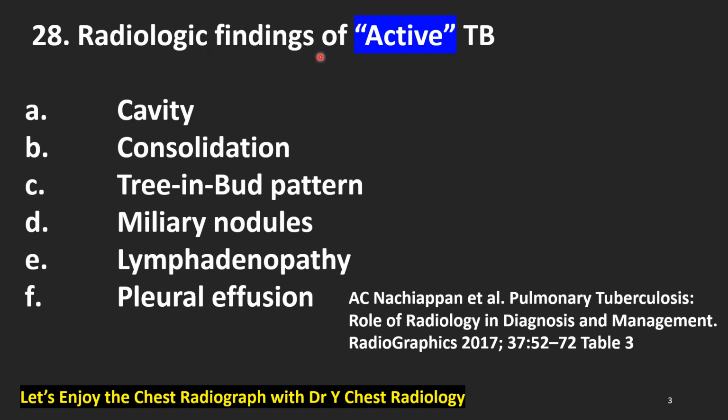Radiologic findings of active tuberculosis. Actually, this slide is the most important slide of the tuberculosis of 3 sessions. It was written by Dr. Nachapan et al., Pulmonary Tuberculosis, Role of the Radiology in Diagnosis and Management, Radiographics, year 2017. I repeat this slide again from last session.